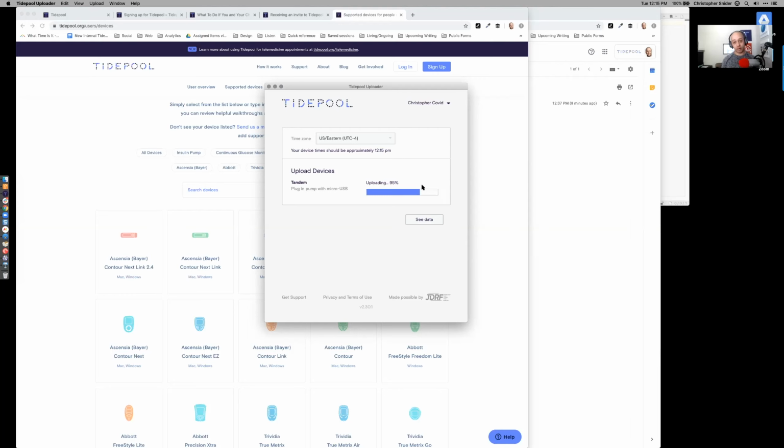Wait for the progress bar to finish scrolling. And then from there, hopefully there isn't an error message.